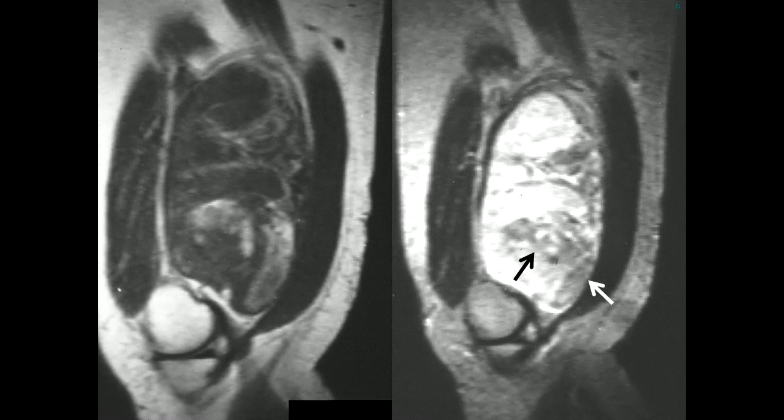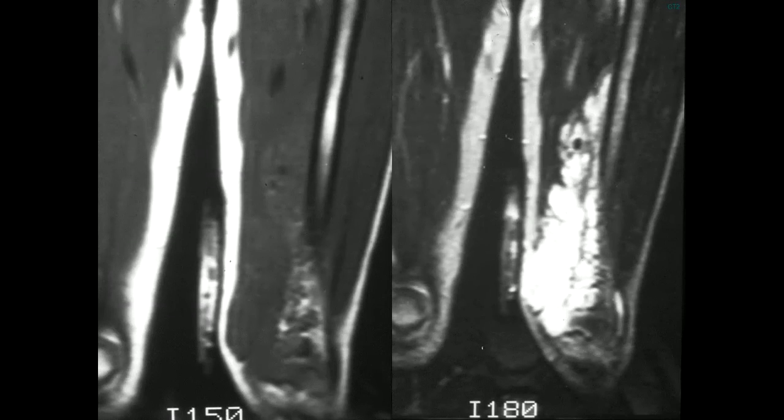Now here another patient with a mass, and if you'll notice, high signal intensity which sort of infiltrates the soft tissue. There's some fat knit in this very lace-like pattern, and this pattern of growth and this pattern of fat within it is highly characteristic of vascular tumors, in this case an intramuscular hemangioma, which infiltrates the muscle as it extends. And of course, those of you who are very observant will notice some signal voids, in this case secondary to the phleboliths which were identified on radiograph.